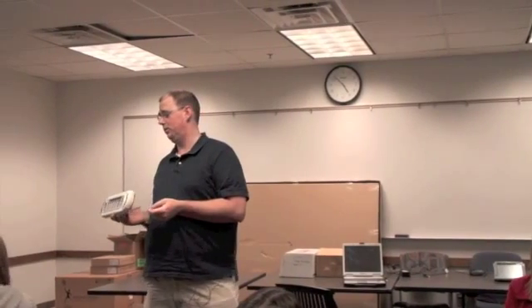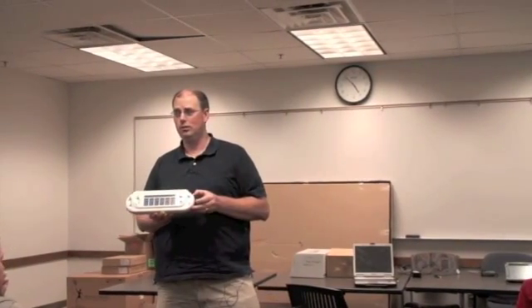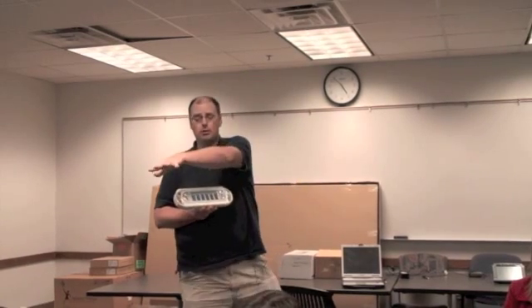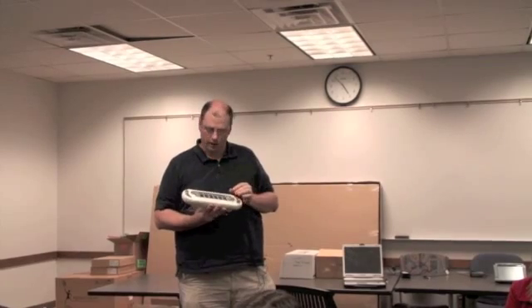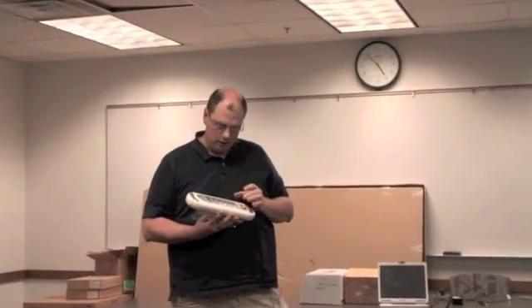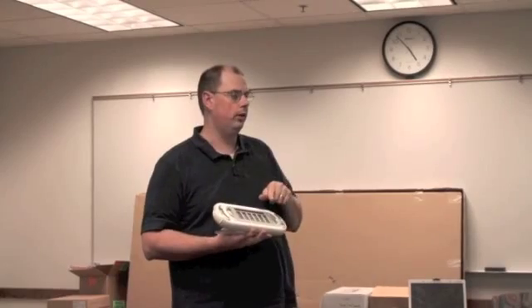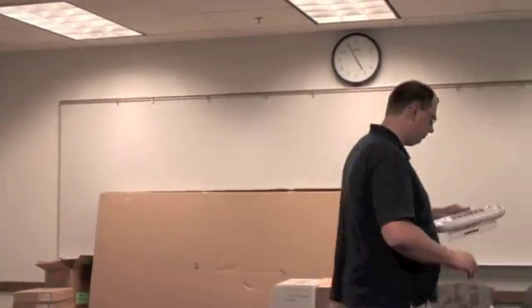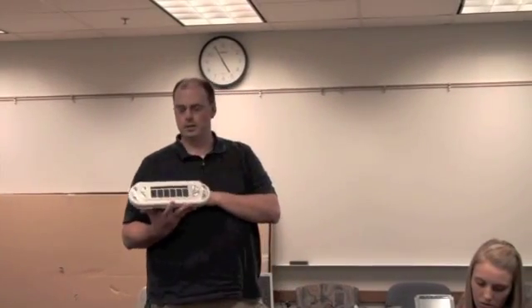So this one's called a Tango. This is a dynamic display augmentative communication device. Does that make sense? No. That means the screen is going to change itself. Does that make sense? So I was on a paper display communication device or a static display communication device, and I'm jumping to something that as I interact with it, it's going to change. Now that makes sense? But in this one, it's a nice little communication device.